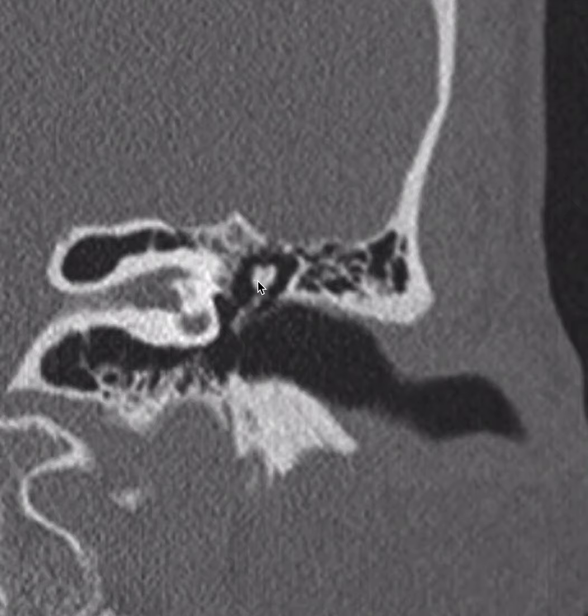You'll also notice on this slice that we're starting to transition down to the mesotympanum as we go from the neck of the malleus to the manubrium and then umbo. These portions of the malleus will articulate with the tympanic membrane right here. We also see the tensor tympani tendon right here as it goes toward the malleolar neck right here.